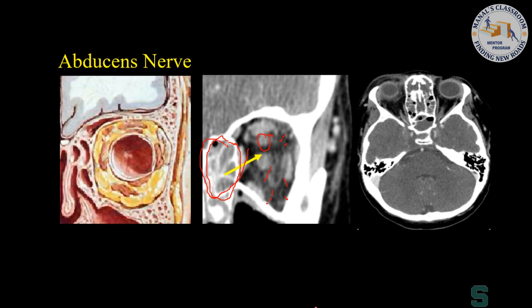It's quicker, it's cheaper. So notice here in the dural sinus, we can see good enhancement here. Everyone see that here? So we see enhancement in the dural sinus, but where do we not see enhancement here? So what's enhancing here? This is the artery. When we look back in the dural sinus, we can see venous enhancement. But if we see venous enhancement here, there should be venous enhancement in the cavernous sinus. Do we see any venous enhancement in the cavernous sinus? So in this case, we were able to make an early diagnosis of cavernous sinus thrombosis.